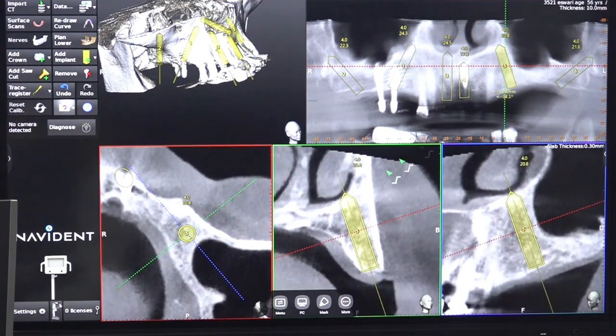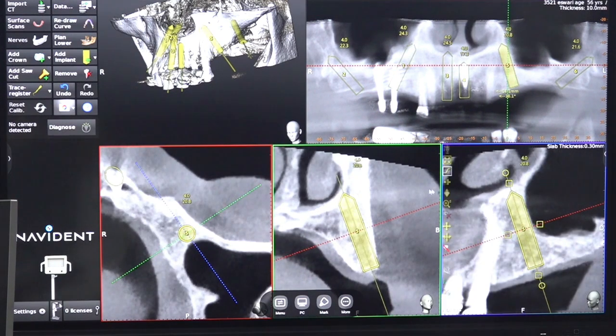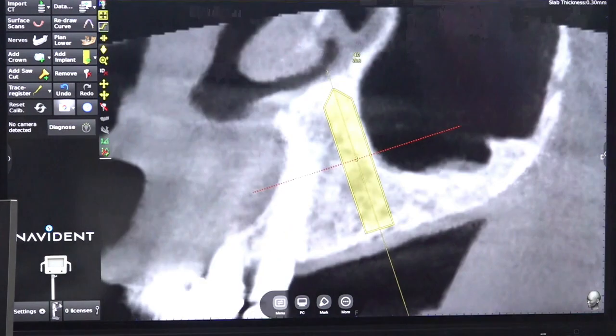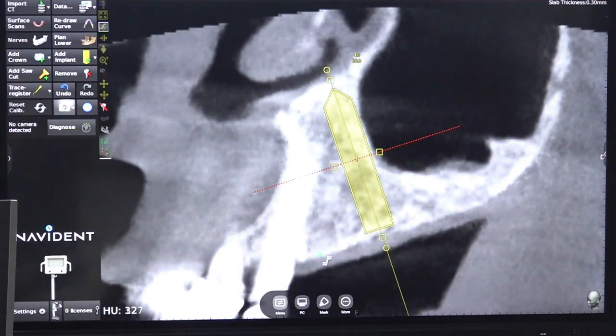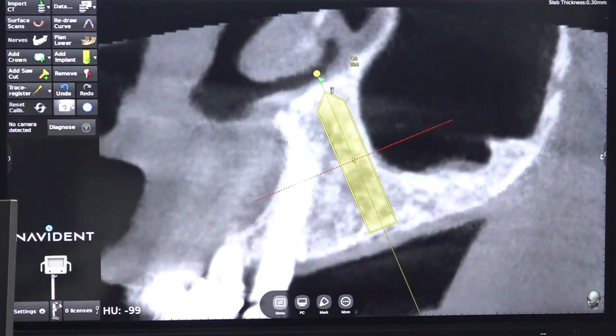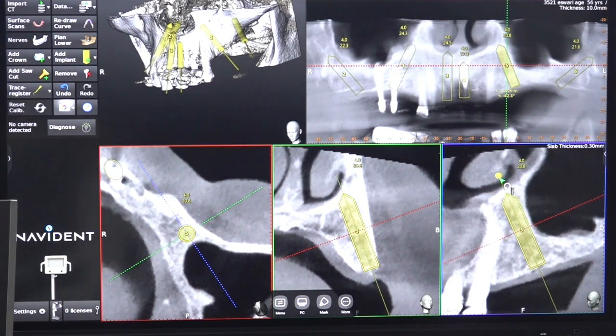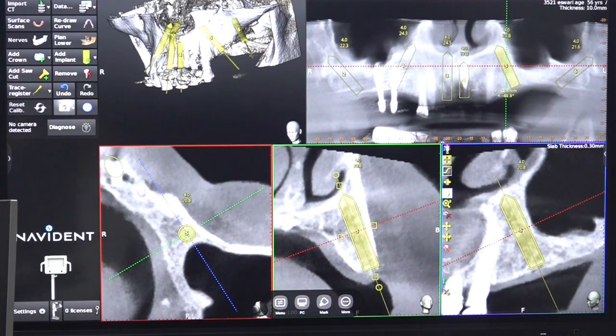Now we will see the left nasomaxillary buttress area. So left side patient is having a canine. So from the canine, this is canine, this is first premolar, this is second premolar. From the second premolar we can start. We have to tilt medially. So how much to tilt medially? We should not go into the sinus. So for that we are using this trick.